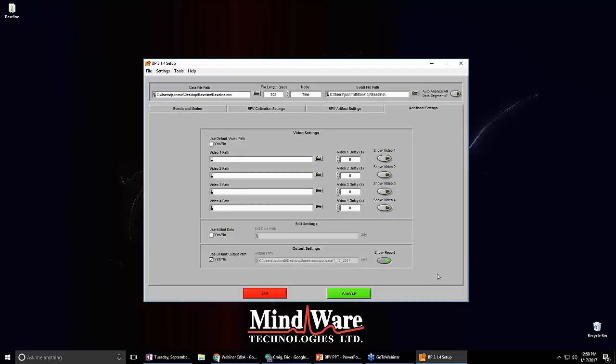Finally, we have additional settings here. If you have a MindWare system with the synchronous video and you save your video files along with your physiological data, when you pull up your MWI file or your MW file, it should automatically find these videos for you. This should be checked and it'll find those. If it doesn't, we can simply uncheck that.